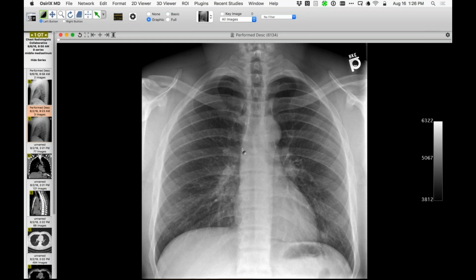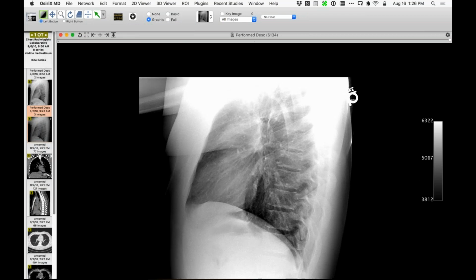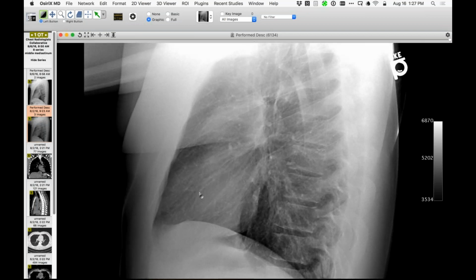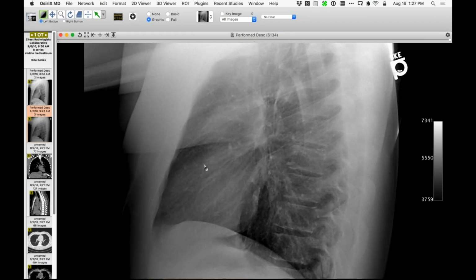So he was then sent to the ER, which I think was a mistake because they got really concerned about him. Howard: Before you go to that, can you show the lateral? Yeah. Let me bring up the lateral for this and bring it down and see if we can see anything. Are there any good clues on the lateral? Boy, it's... No, you know, looking for like air around an artery or something. Right, or the anterior wall of the trachea. Yeah, no, I don't see anything. It's all really just paracardiac. It's really, can't see it there.